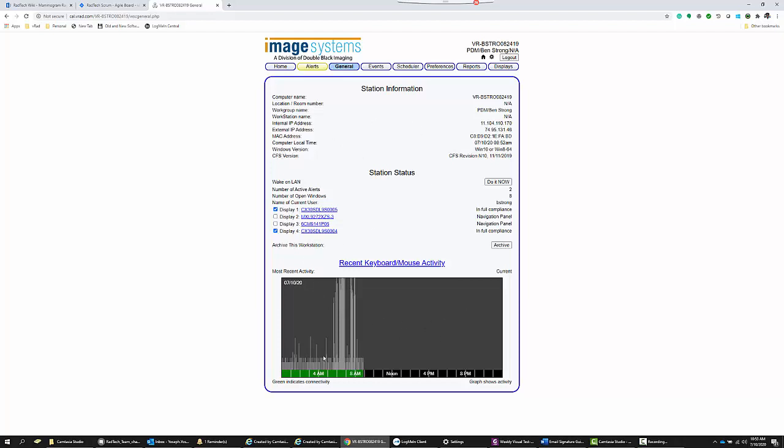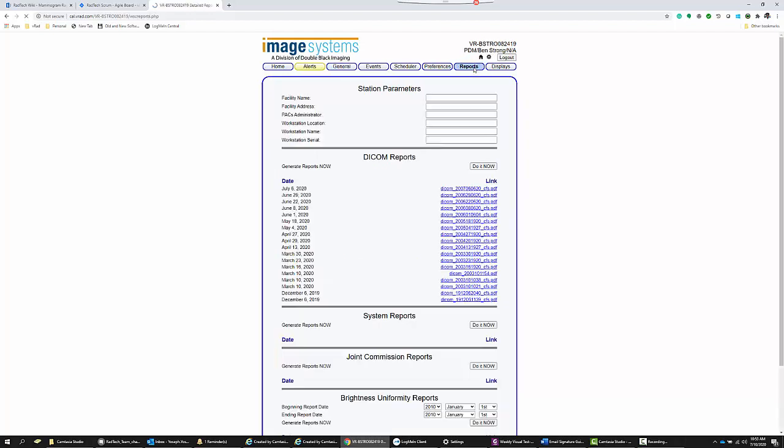It also tells you if the system is online and was used today or not. As you can see, on this date it was used, the mouse and keyboard movement. That's pretty cool, but means nothing really in terms of accessing the computer or anything. It just tells you the system has been in use. Let's go straight to the report. That's where you want to be.